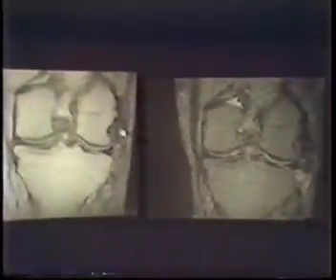And if we just go one cut more anteriorly, because sometimes you like to see it in a couple of cuts just to make sure, you can see that at no point do we see the nice normal ligament. And again, the point of the tear can be very nicely seen here as a focal area of high signal intensity. And this can be very helpful to the surgeon, because he really would like to know ahead of time exactly where the tear occurs. And then he can plan his surgery.